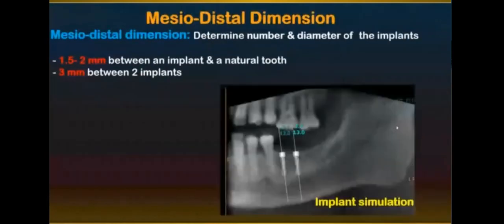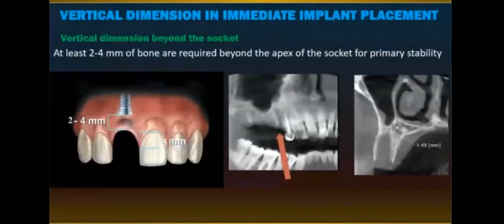So for this reason, we care also not about the length as a length. We care about the bone which is going to be beneficial in our treatment planning.